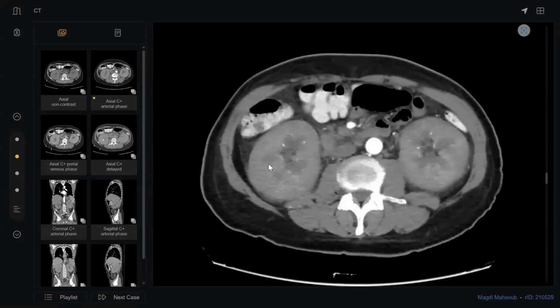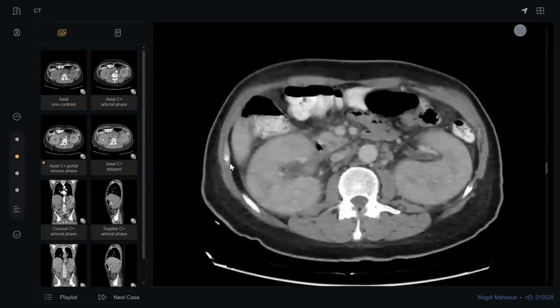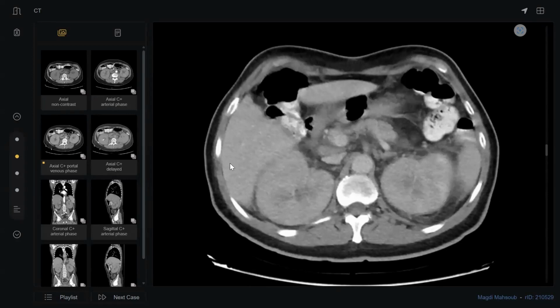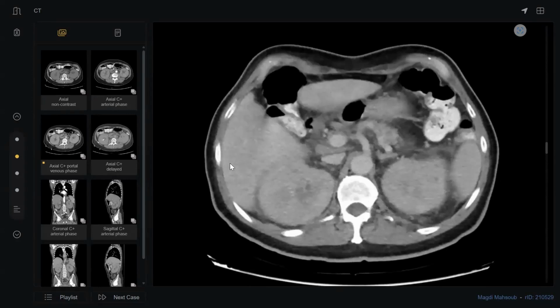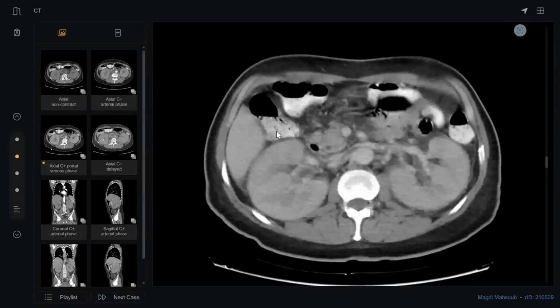The kidney here, this is the arterial phase. Then there is no definite focal lesion. And the second point, the fat is not smudged, just very minimal blurring. Where is the clue here? This is the clue. Till now, bilateral enlarged kidneys for differential.